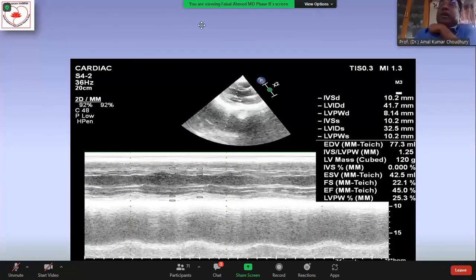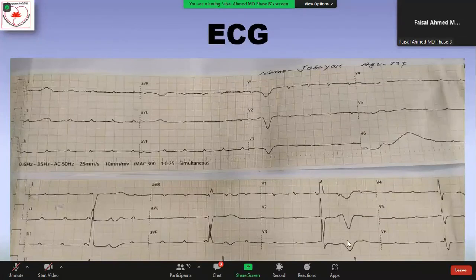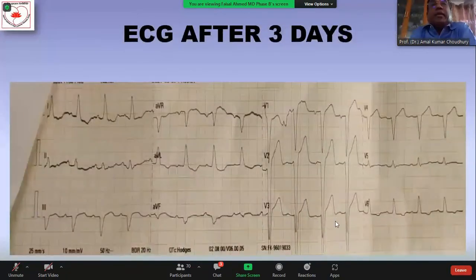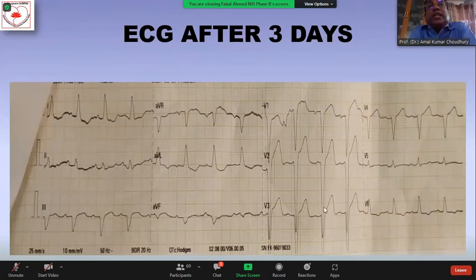Faisal, what is the diagnosis of your third ECG? First I showed high grade, that means 5:1. The second was complete heart block. The third, which converted, is this an incomplete LBBB? Sir, incomplete LBBB. There is a dominant S wave in V1, and there is a dominant R wave in the lateral leads. The complex is a bit narrower, and there is left axis deviation. And so the PR is not that prolonged, so we can say that marginally high. Then can this be called trifascicular block?